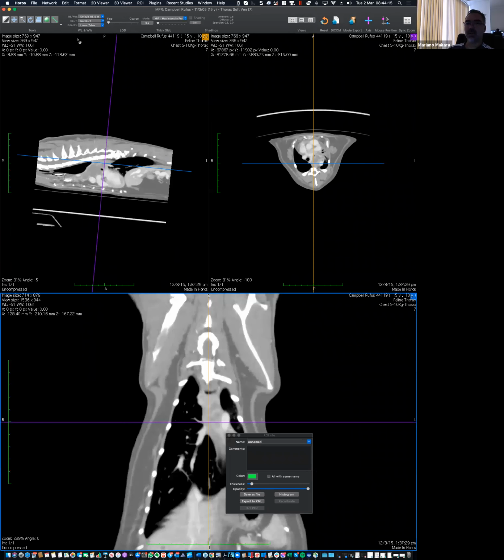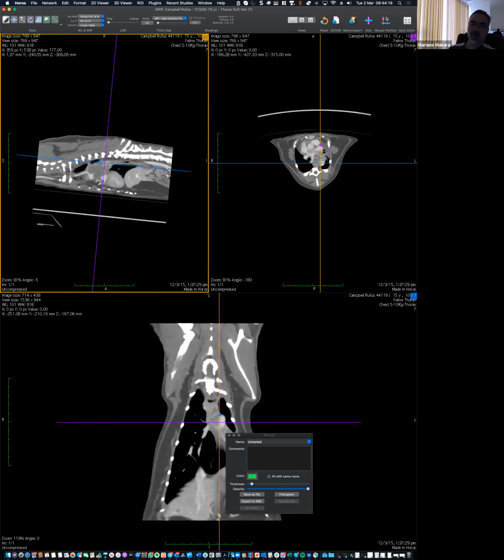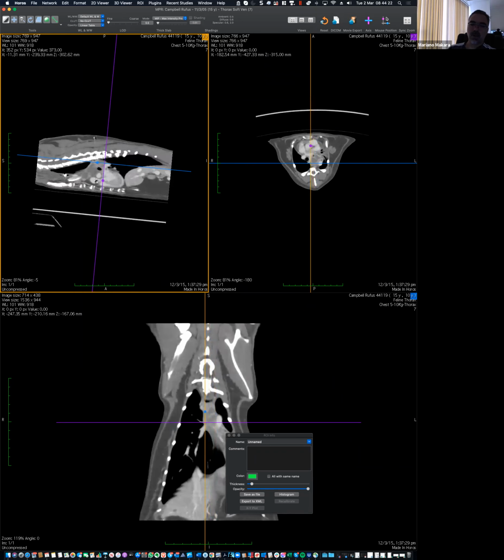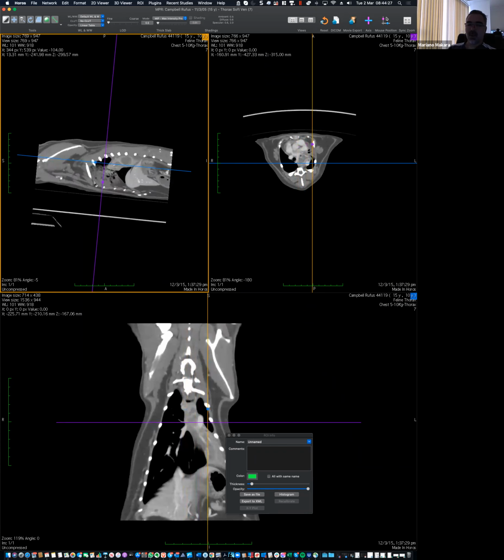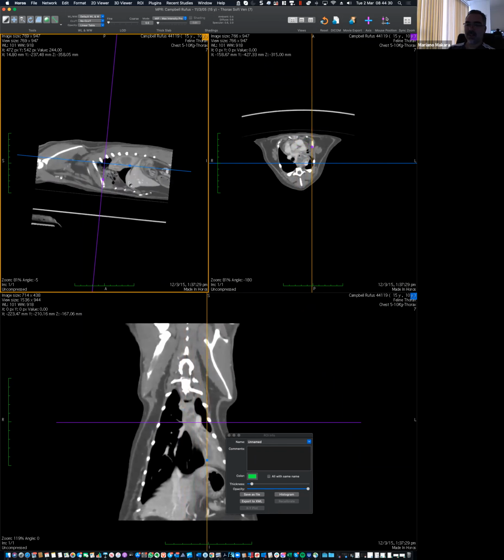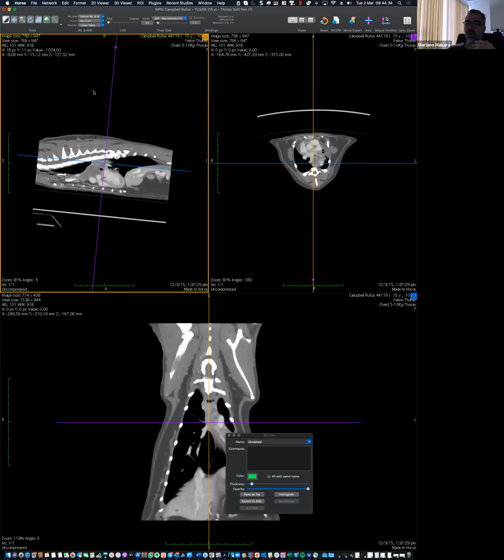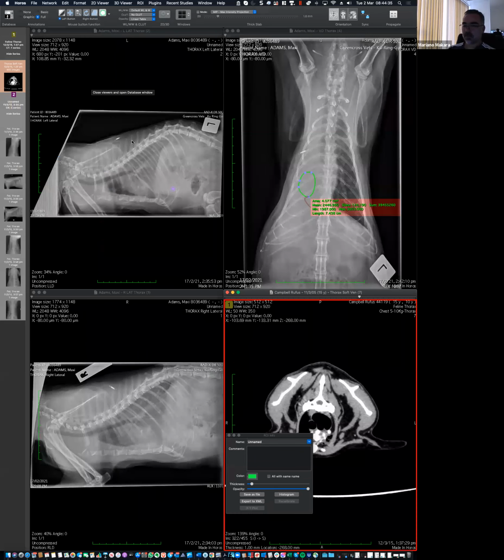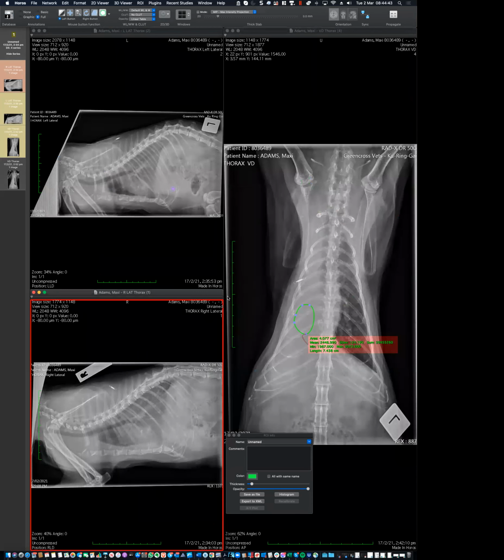So coming back to our case, is that okay? In this case, it really grew through the airway and it went into the mediastinum. But basically, this was a bronchogenic carcinoma. And you can see how it resulted in atelectasis of those lung lobes. It was just because the neoplasia was growing, extending through the airway. So, Mariano, can you explain why we don't see, I guess, a worse lateral view?